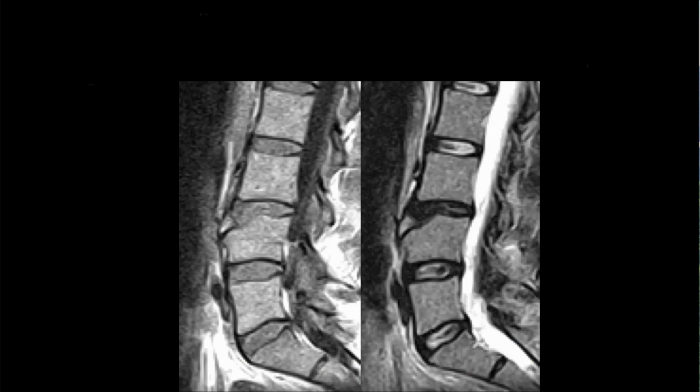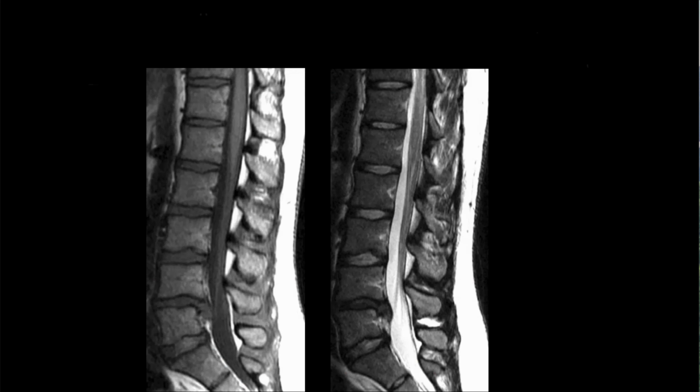John, you want to say something? I remember hearing people say that this was a congenital entity. Yeah. But I think that this is more of a fracture from years ago. Yeah, and I agree with you. All righty.